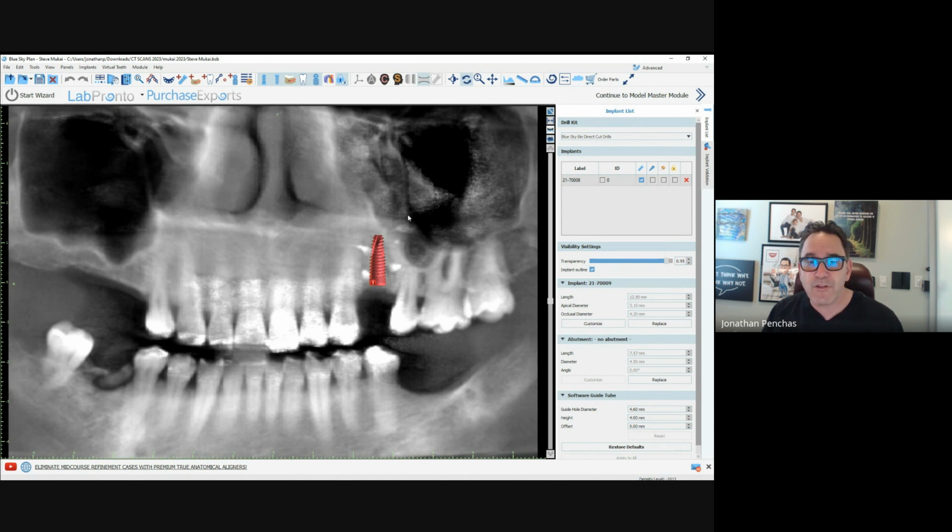Again, you can refer to the ENT for sinusitis, or you can give them some medication for it, but you have to ask them, do you feel this sinus is giving you problems? Is it draining, not draining? I recommend you see somebody for it, and you can write in the chart that you saw something was wrong. Same thing here with this pathology.